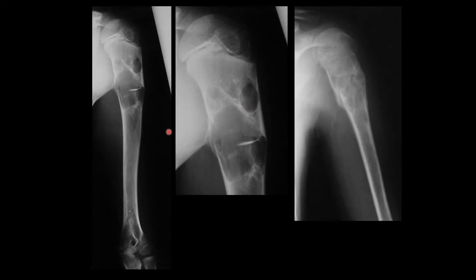Here again is an example of an immature skeleton. There's an open growth plate. This is an older child because you can see now the radial head is formed. Here we can see the capitellum. So this is probably a child 12, 14 years of age. You can see it's a multiloculated bone cyst. You can see there are multiple bone cysts. So again, we've got multiloculated bone cysts in the left humerus of an immature skeleton.